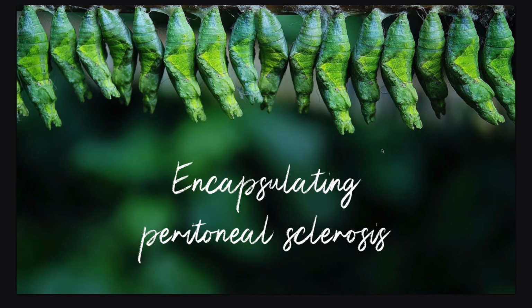And when you do the CT, you'll find that there are some dilated small bowel loops. This is not like a proper mechanical small bowel obstruction, but you might see that as a complication of peritoneal dialysis. You're likely to come across this as an exam film, to be honest with you, also when you do your 2B exams, because lots of examiners will still have this kind of example in their collections.